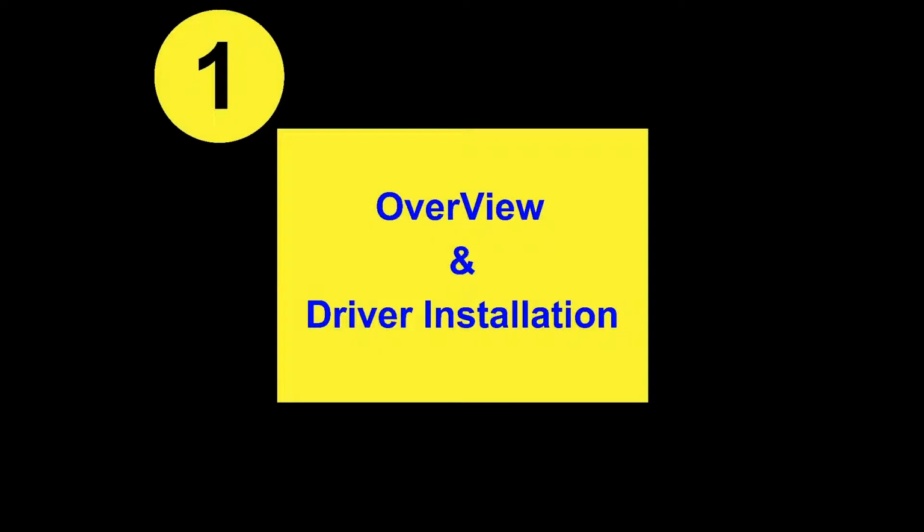This is a brief overview of the Viewpoint eye tracking software, how to set up the camera drivers, and an overview of what's included in various folders.